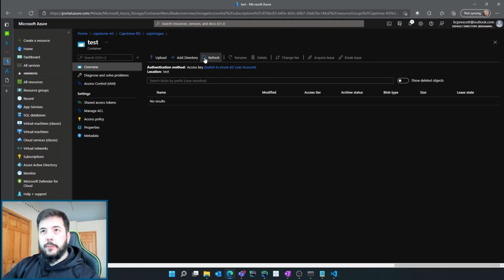Now, what this actually does in the background is it's saving this file to our blob storage in our data lake. The reason we did that is just so we can track files for inference at a later date. We ran this over another additional 1,000 images when we did our test. So not just a single upload here, we ran it through 1,000 programmatically. And essentially that return, that's where we got our result of a 0.95 F1 score.